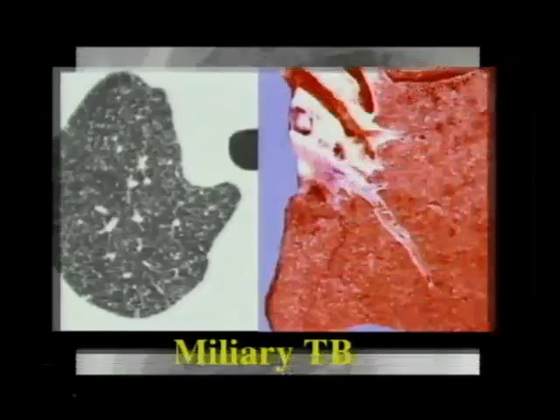An example of miliary TB on chest radiograph: you cannot recognize that this is a random pattern on a chest film. You can't see the presence of subpleural nodules, etc. But the appearance we usually see on a plain film is rather diffuse and uniform lung involvement. Looks sort of like the CT scan without recognizing the precise distribution.